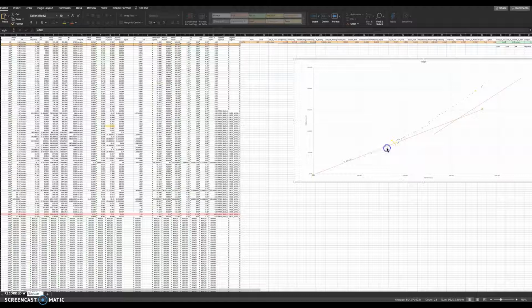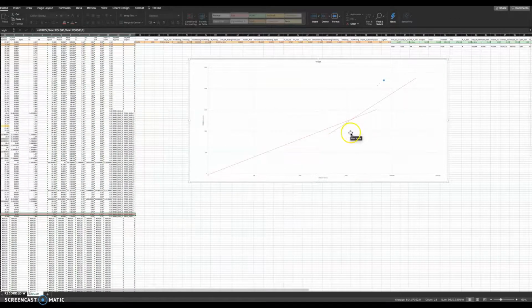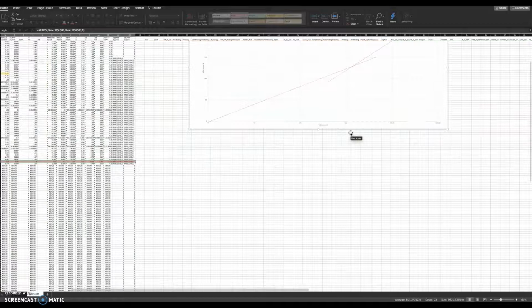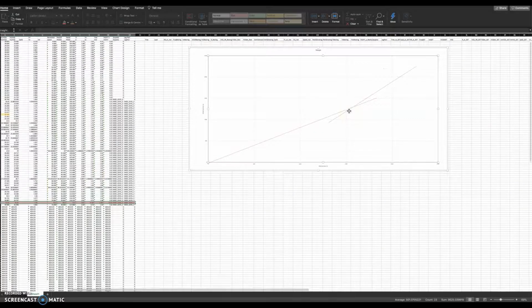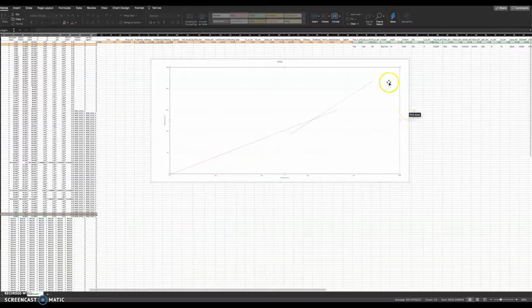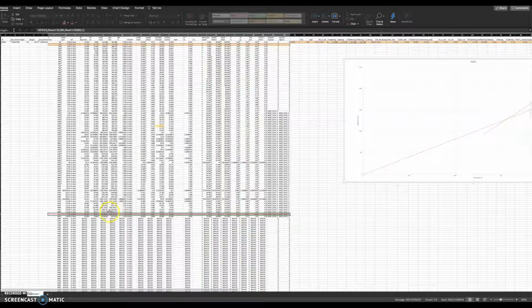Each of these dots corresponds to a sample here. If you drag this all down to here, and this down to here, you'll be left with one spot up there. It should just be one. Sometimes it doesn't update correctly, so just check that. Drag this all there. Doesn't matter if it was the first and the second one.